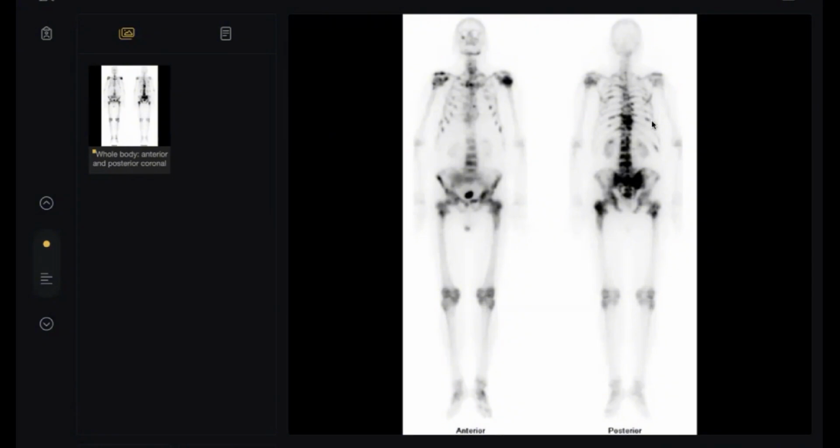Because of the increased mitotic activity and increased osteoblastic activity. In another word, which part here? Suppose this is a metastasis. Which part here in this vertebra is uptaking the contrast? And here and here. The central body. I mean the metastasis itself or something else.